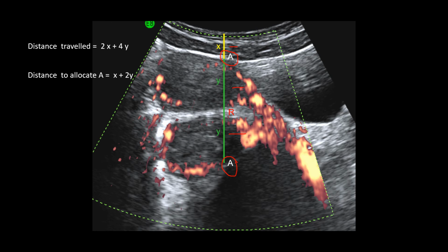Repeat this for the rest of the uterus. So here we have a point B, it will be here, a point C, and this will be here, and a point D, and it will be here, and therefore we get a mirror image of the uterus centered on the reflector, which is here, the anterior wall of the rectum.